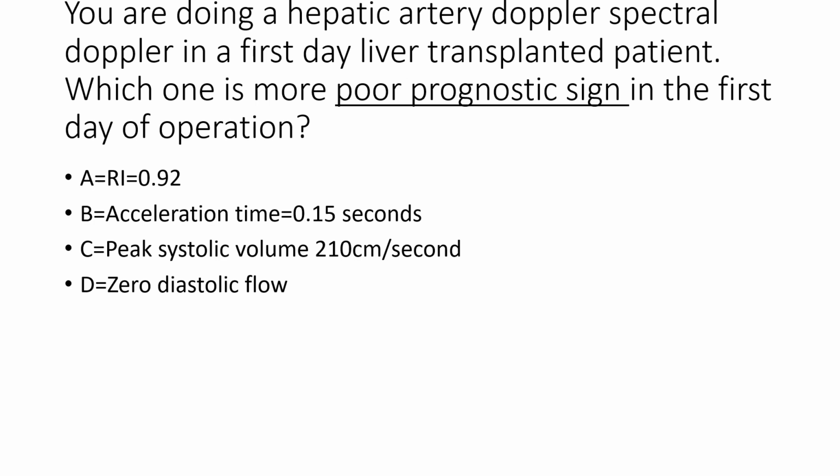You are doing a hepatic artery spectral Doppler in a first-day liver transplanted patient. Which one is the more poor prognostic sign on the first day of operation?